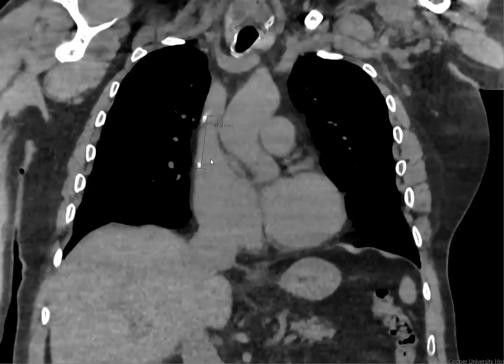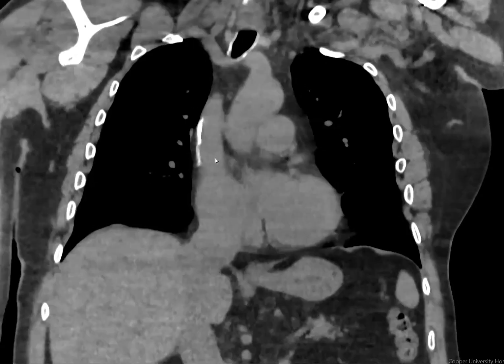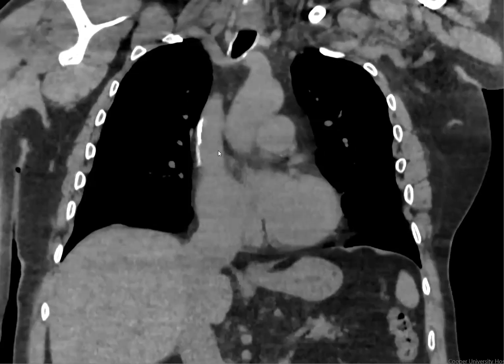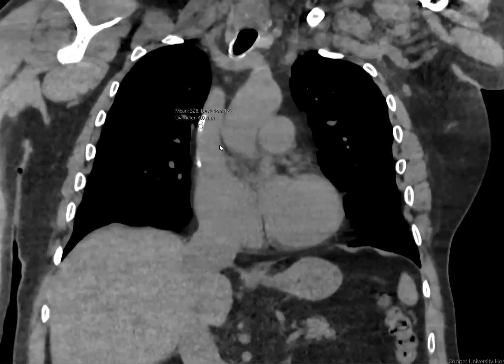Over time, when the fibrin sheath is there for a long time, there is dystrophic calcification over that fibrin sheath. And since the fibrin sheath has deposited along the catheter, it's linear in deposition. And so the superimposed calcification over that fibrin sheath is also linear and gives an appearance of a catheter that might be left behind.